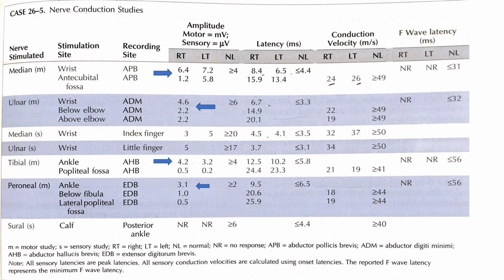be seen in the detailed waveforms, and most probably we would have seen temporal dispersion also, which we cannot assess in this chart because the distance along the nerve is not given. So the presence of these conduction blocks definitely tells us that this is an acquired etiology of demyelinating neuropathy, and depending on the clinical scenario we can assess whether the patient meets the criteria of GBS or CIDP or not. Definitely GBS and CIDP is not an EMG diagnosis but a clinical diagnosis.